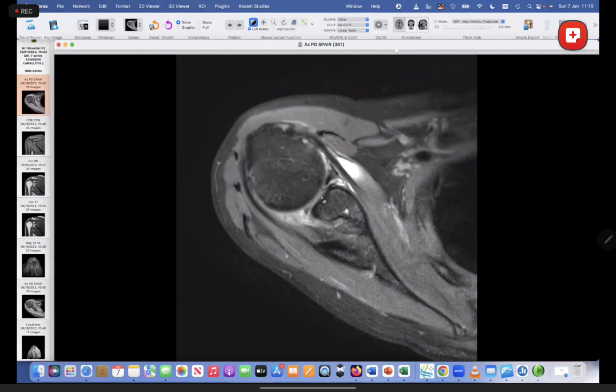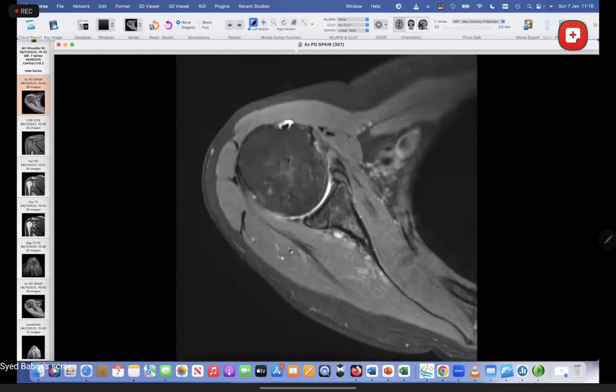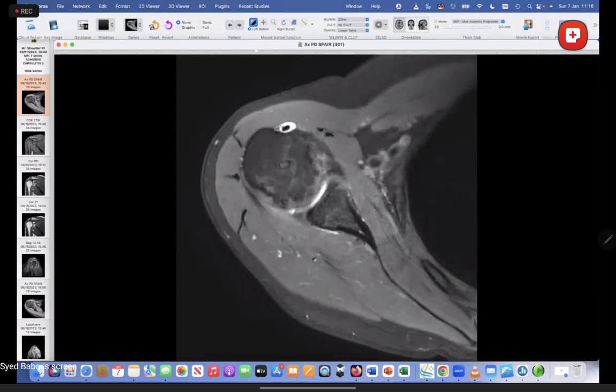Okay, so you keep looking at the back. Now, if you look at the posterior part, this labrum also does not look normal in this particular case, but I would normally look at it because it should have been a nice black triangle. All you see is a tiny black dot in the middle, which means there may well be a previous instability in this shoulder, and the labrum may well be degenerate, may well be abnormal.